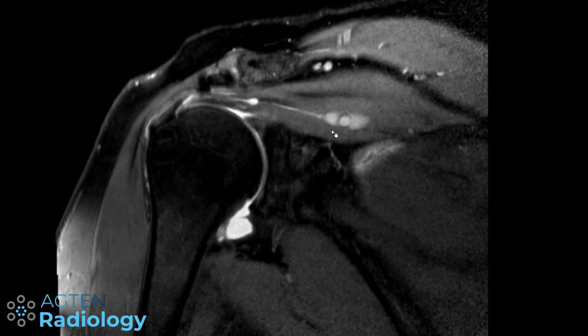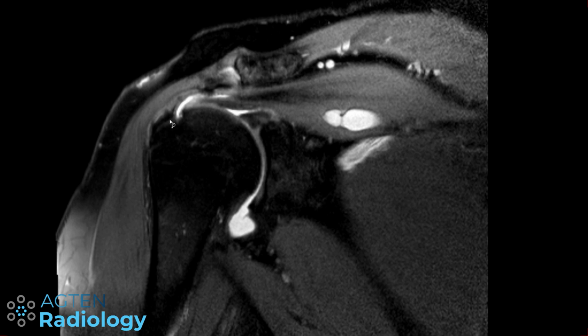the rotator cuff tendons. So what basically is happening, you have a tear of the rotator cuff tendon that can be an articular-sided partial tear or a bursa-sided partial tear or even a full thickness tear. And you have fluid from the joint or the bursa entering the tear and then delaminating through the tendinous substance medially into the muscle and then collecting here and forming a cyst there. And therefore it's a sentinel, or it's a finding that should prompt a thorough search, as they always write in all these publications, a thorough search for a rotator cuff tear. See a cyst, think rotator cuff tear.